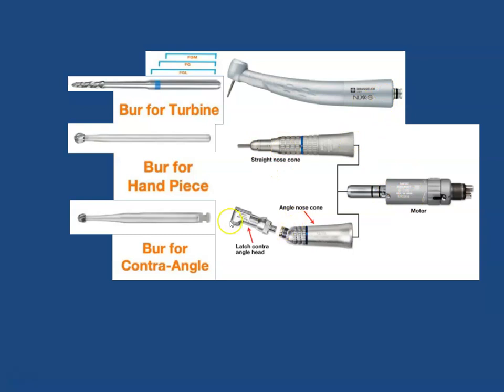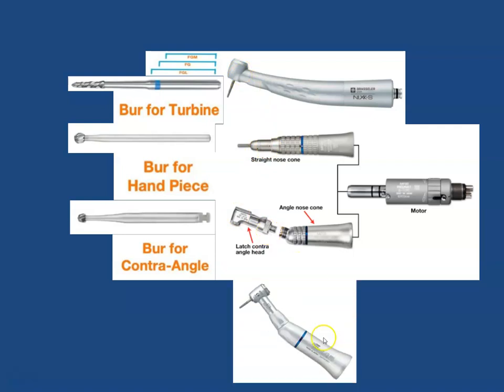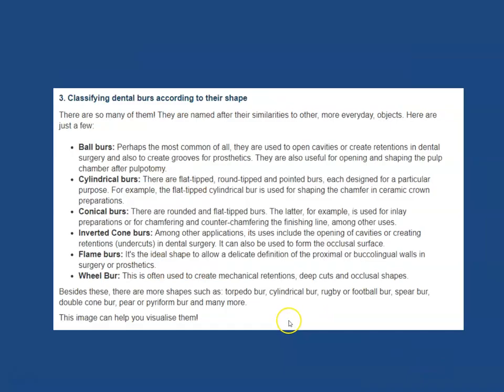This motor is inside in here also, but this one moves really fast. These move slower. Now, if you look at it, here's another example of a contra-angle handpiece. This one has more friction to grab onto the hand. This one has no friction. It just has nice comfort pieces, and your fingers wrap around here.